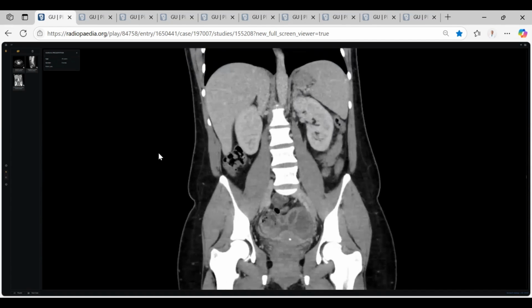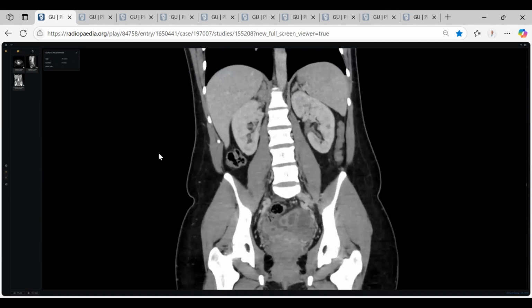With this heterogeneous lesion, which is peripherally enhancing and fluid attenuating in the center and larger on the left side, I am thinking of a tubo-ovarian abscess associated with hydrosalpinx or pyosalpinx. In my routine practice, I will measure the HU of the contents, especially the tubal contents, to know the character of the fluid. Adjacent fluid is also noted in the pelvis.